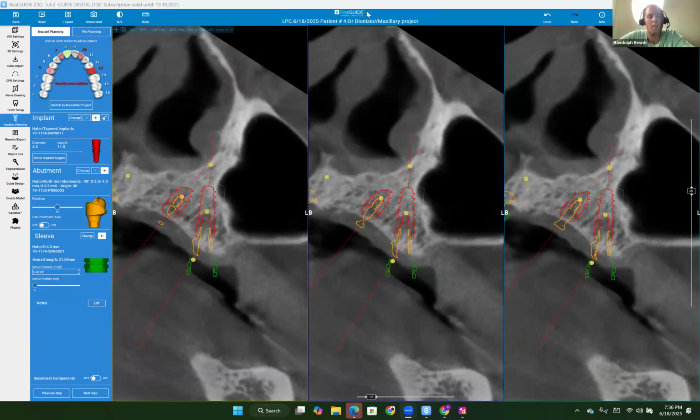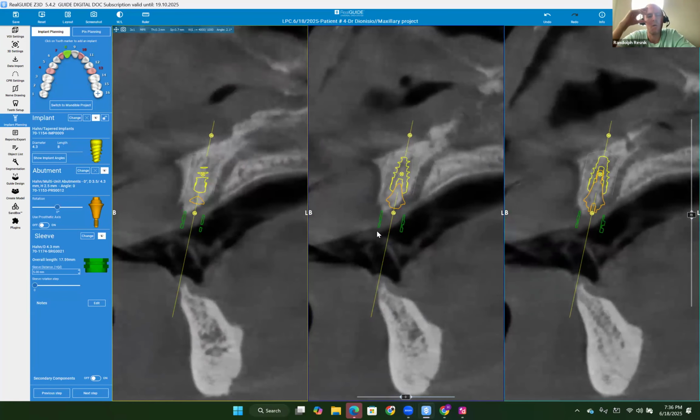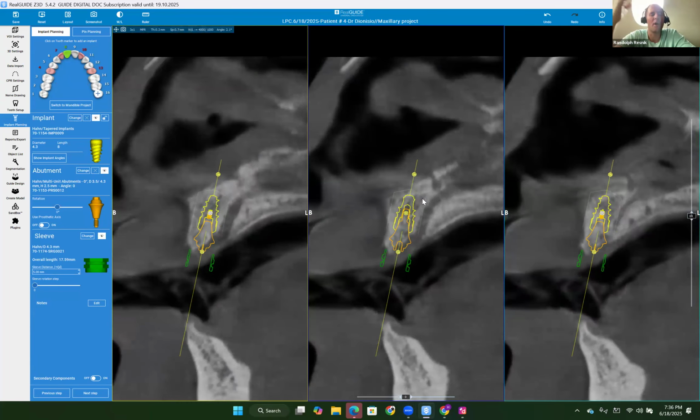Yes. So what's difficult with what we have here, Doc, is one, we have very limited bone. We have some pathology around pretty much the area that has the best bone, which is that canine, a pretty significant periapical radiolucency. And then lastly, we don't have any reference to where the teeth need to be. His existing partial has the teeth worn down, so they're not in the correct restorative position in terms of aesthetics, phonetics, function. If we were to use his partial, we'd be planting the implants at the incorrect position.